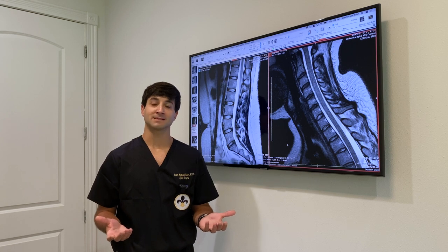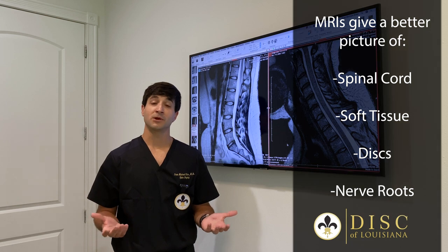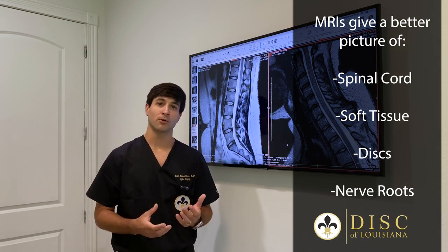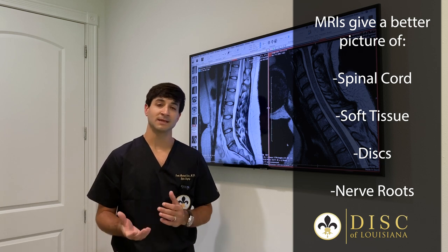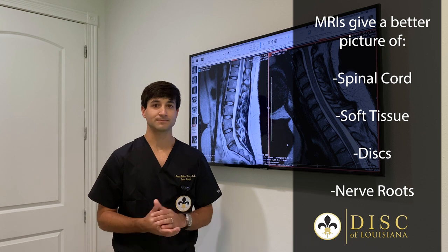We often get asked the significance of an MRI in clinic. An MRI in general gives us a much better view of soft tissues, particularly around the spine. We're able to see the spinal cord, soft tissue, disc, and nerve roots much better than your traditional CT scan or x-ray.